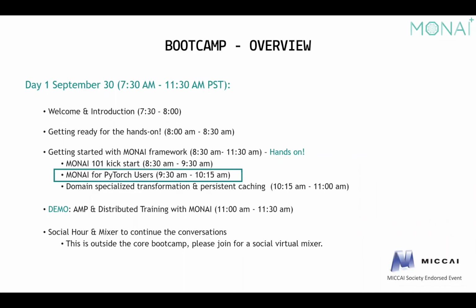so you can continue to tinker. And this time we'll be tinkering with an end-to-end network, which does everything from fetching the data to creating the data sets, to instantiating the networks and running a training validation loop and looking at some visualization.